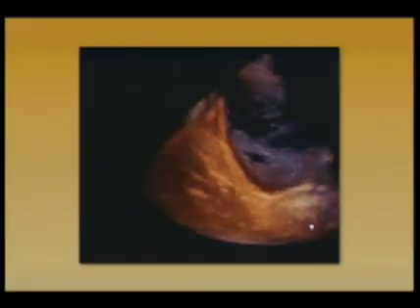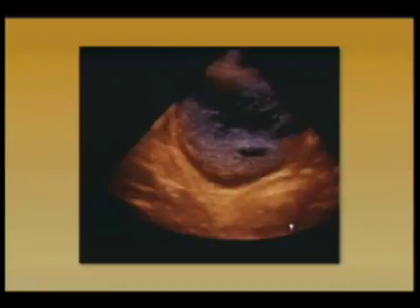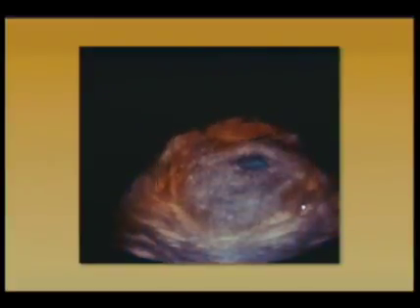And this is particularly advantageous when you're trying to show these sorts of structures or pathology to other physicians who aren't used to looking at 2D ultrasound images or to use for teaching purposes. Vessels are other ideal structures because they're filled with flowing blood, which provides good contrast to both the vessel wall and any abnormal structures within the vessel lumen.